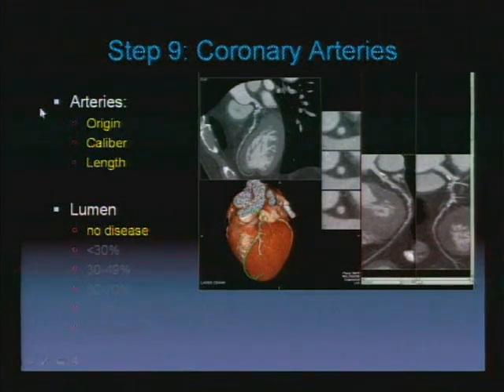And just to orientate you again, the volume rendered view, here's a curved view that matches that. These are luminal views that center upon this dot here. So where this dot is, there's this central box here, and then this is a millimeter above and below, and these are the curved planar views of that vessel.